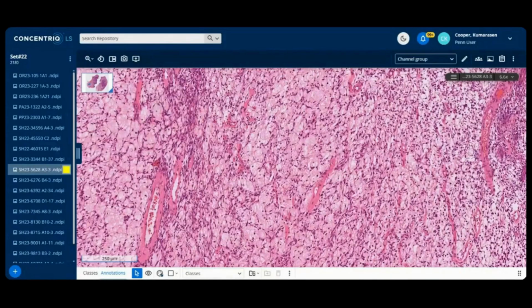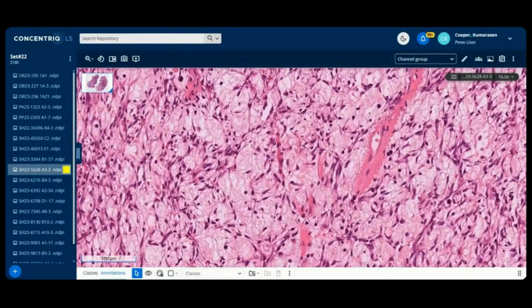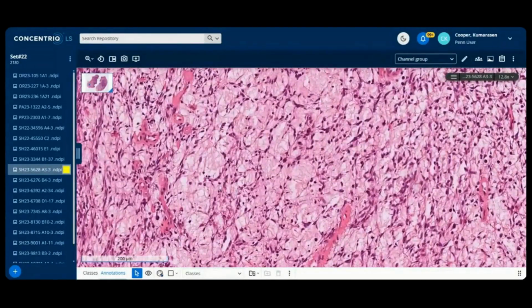Omar has come up with the immunos and the FISH, so that's good. Myxoid liposarcoma would come up because of this almost chicken wire type pattern. But remember, the chicken wire in myxoid liposarcoma is as a result of the vessels. These are tumor cells. So my choice of description here would be more of a laciform pattern.